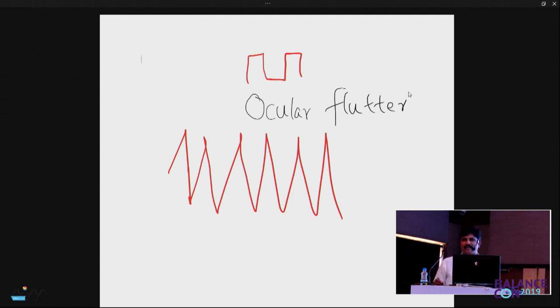So these are the different kinds of words that we should recognize. So we recognize slow movements, fast movements, and no movement as the three alphabets, and then we know so many words. Now shall we start going to the little more advanced words, and then after that we will form sentences. Shall we?